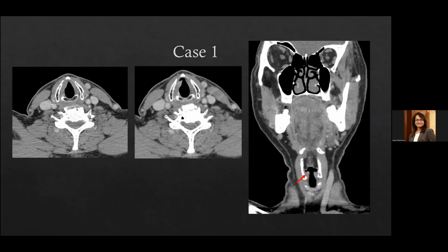So that more or less ends my presentation of pre-treatment imaging of laryngeal carcinomas and radiological anatomy. Now we'll see a few of our own cases and how to report them. What we are seeing here is a patient who presents with hoarseness of voice. There's a small lesion in the anterior part of the vocal cord on the right side. There is no involvement of the anterior commissure. It's a pedunculated lesion. On the coronal imaging it just shows a mild irregularity. The paraglottic fat is maintained bilaterally very nicely. So this is a small T1 lesion of the larynx.